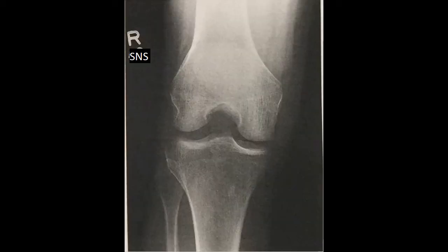All right, so then we moved on to do the AP axial projection of the intercondylar fossa, which is also known as the Beclere method. So you can tell that it is properly collimated. My marker is on the image. You can see the open intercondylar fossa. You can see her intercondylar eminence centered there in that joint space.